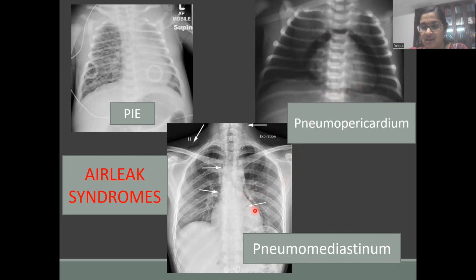Pneumomediastinum is something which is commonly encountered, and you see this kind of picture. You get the gas shadow in the mediastinum.